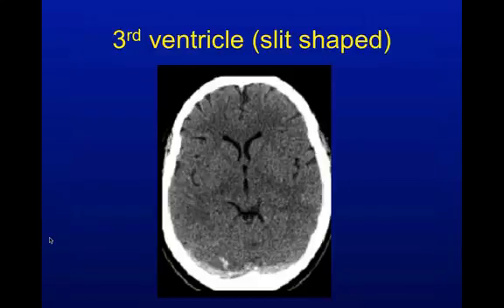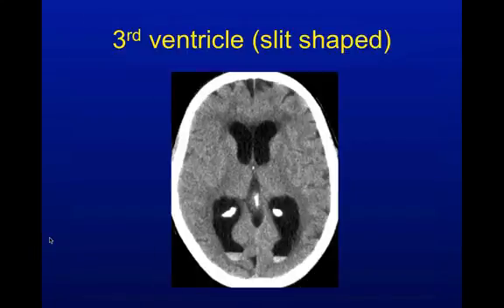Okay, now the third ventricle is here in the center. It's kind of the keyhole slit, but not like the slit-like ventricles that we were talking about a second ago. This one's supposed to be nice and skinny, sitting right there, and connects the two lateral ventricles to each other. So here's that one that we saw a minute ago, and I said it seems like there's a little bit of haloing around that pineal body, and that third ventricle is a little bigger than it ought to be. That's probably where they bled from, and that's layered out here in the posterior horns of the lateral ventricles.